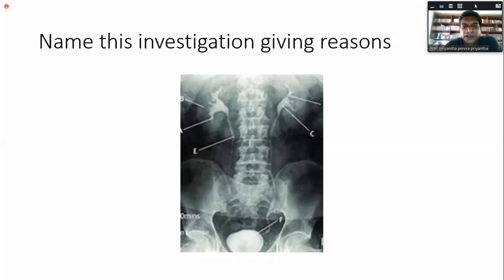Give two reasons for your answer also. What is this investigation? IVU, yeah, IV.